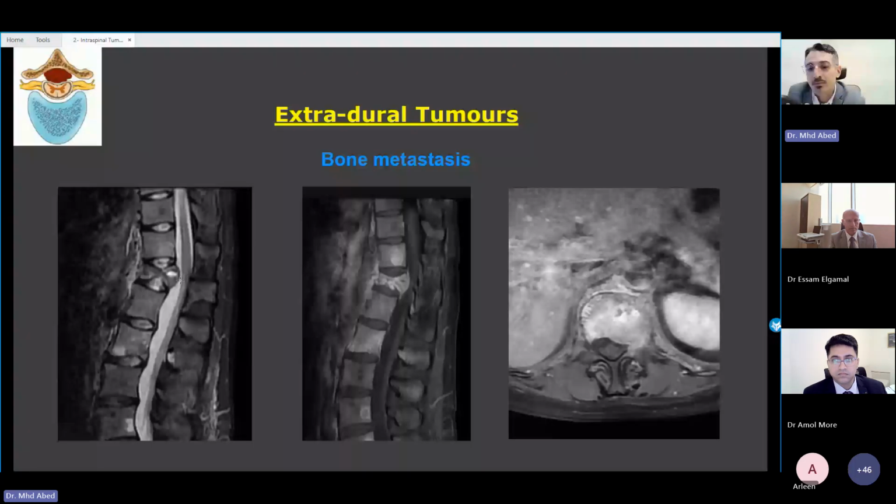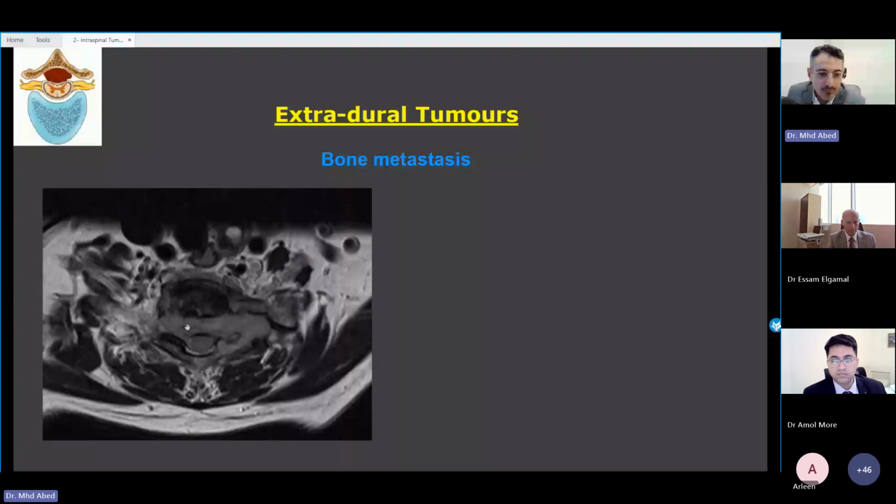If you look at this image, we see a lesion which is in the epidural space. This is because of the extension of the soft tissue component intraspinal. There might also be involvement of the left neuroforamina. Another patient has marked spinal soft tissue component of a bony metastasis, almost surrounding the spinal canal. We can see the dura. The dura is this thin hypointense line. It looks intact, and this soft tissue is causing encasement of the spinal canal.